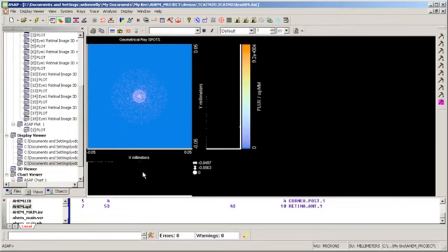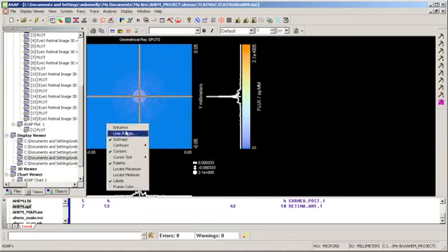I can also go in there and change the particle size as well as the concentration at once. So I can do either or both of those changes in scattering to model cataract.